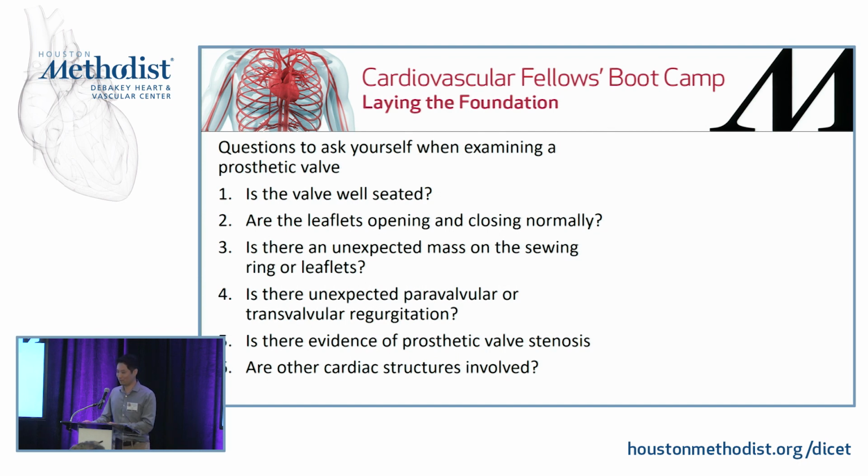Perivalvular leaks are always not normal. Transvalvular regurgitation, you can pretty much look at a valve and say, what's a washing jet, what's abnormal? You have to make that determination.